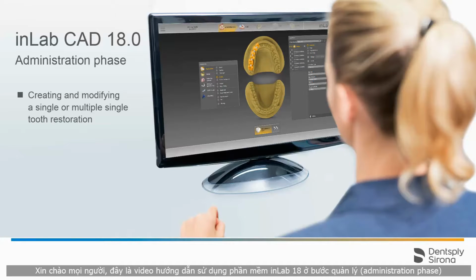Welcome to this video tutorial with the administration phase as topic. In this video, you will learn how to create, edit, or delete a single tooth restoration or multiple single tooth restorations in the administration phase.